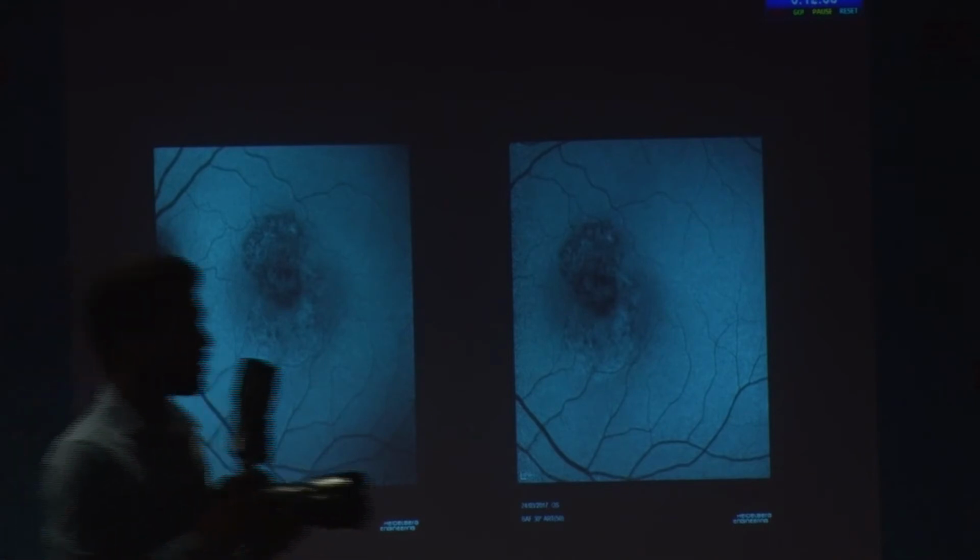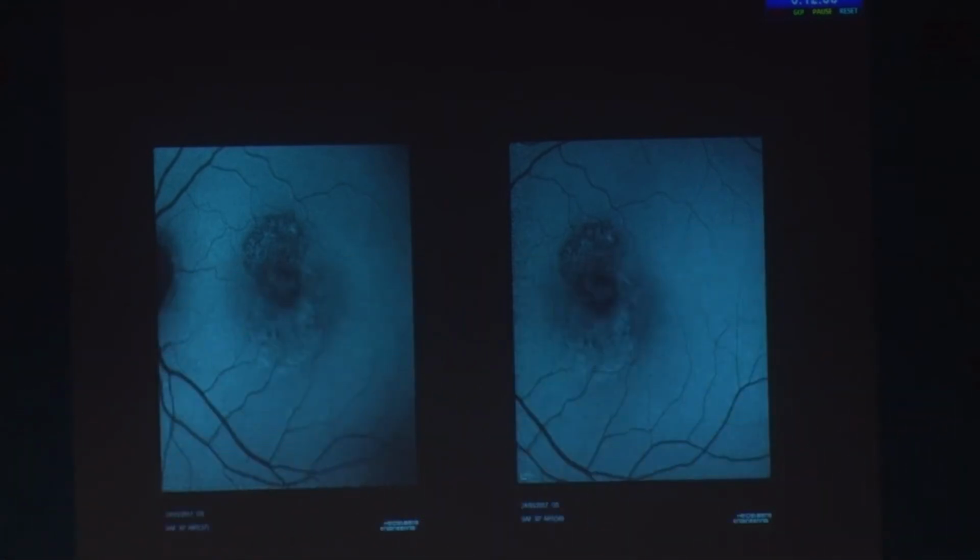So the basic tenet is that you never assess the patient based on one image. So if you know and you've trained yourself to understand that red does not necessarily mean a hemorrhage, then every picture of a Heidelberg is fine. Actually, it is difficult for us to do because we have to retrain our minds. This is pseudo color imaging.